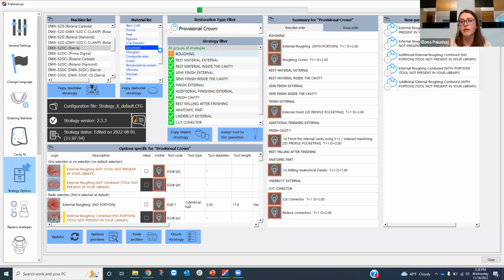And this is where I now get the exclamation point for some of the steps that are new or new options that were added. However, they are not configured to work with the tool sets. So again, R&D is working on it, so we can release those as soon as possible. As you can see, they're always staying busy, but new updates are being released quite frequently, as I mentioned.